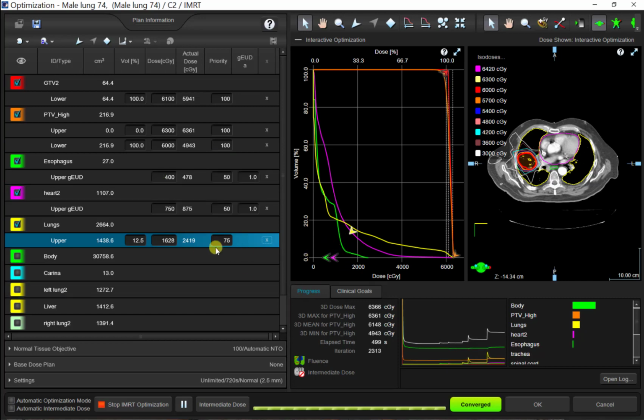If you notice, it's not meeting exactly any of these constraints, right? And that's just how the optimizer works. It will not do exactly what you tell it to do almost ever. So like in this case, I'm wanting the V20 to go down, so I'm putting that objective below the line, trying to just pull the line.